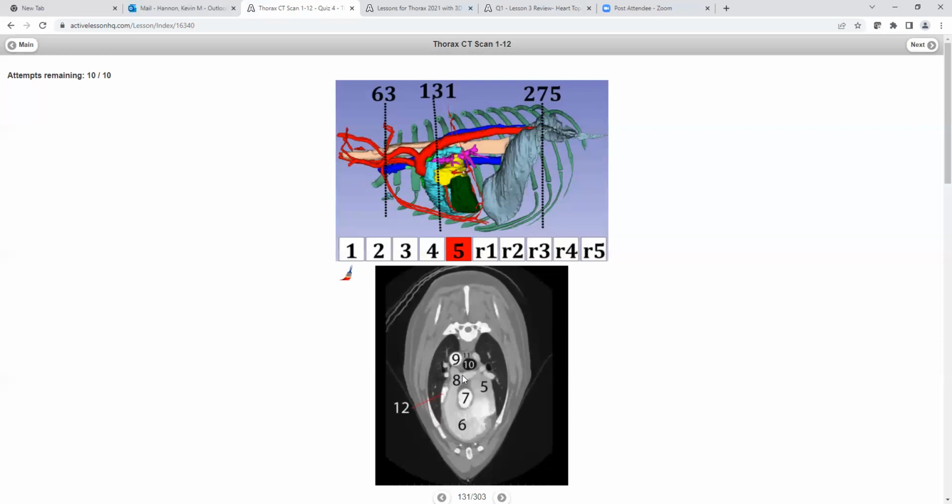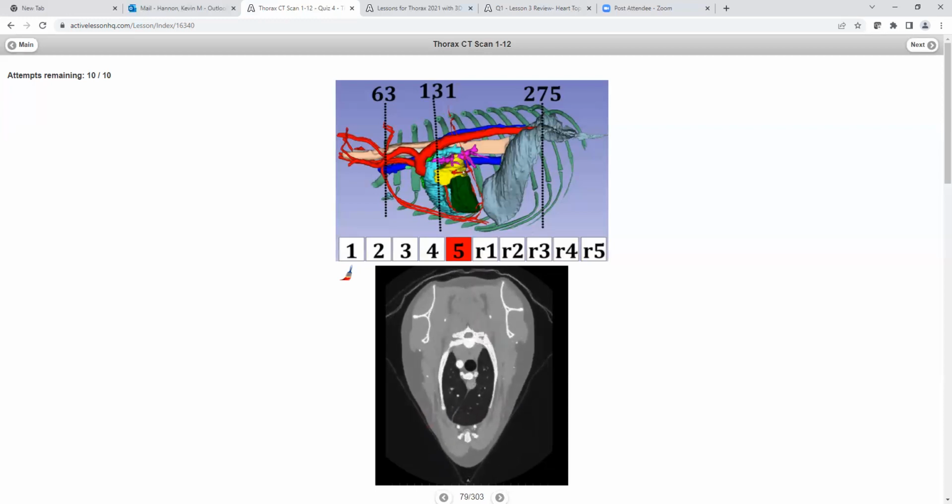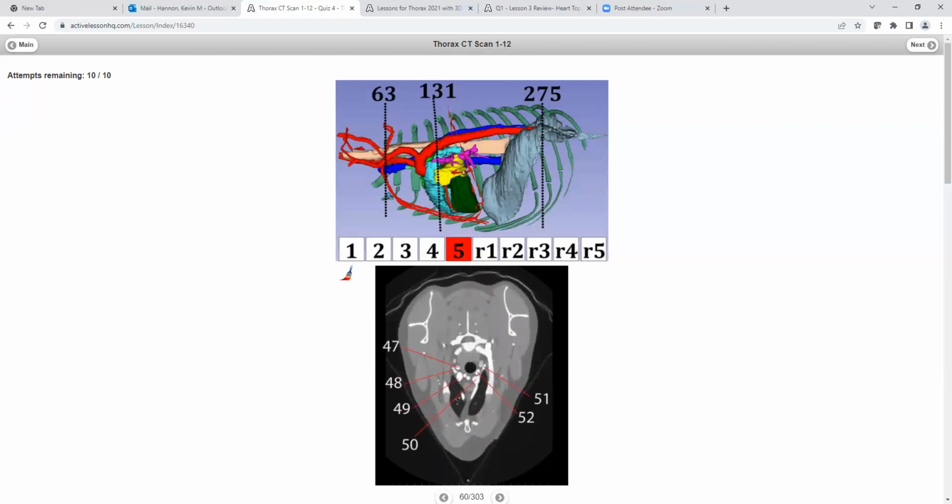Okay, now let's look at a couple tougher ones. Some people have asked some questions, and let's go with number 49 and 50. Okay, unknowns number 49 and 50 on section 60, and let's reason through how we'll do these. Now these are a lot harder. But let's talk about how to do it. So let's start with 49. So obviously these are going to be vessels. So we're talking about 60.